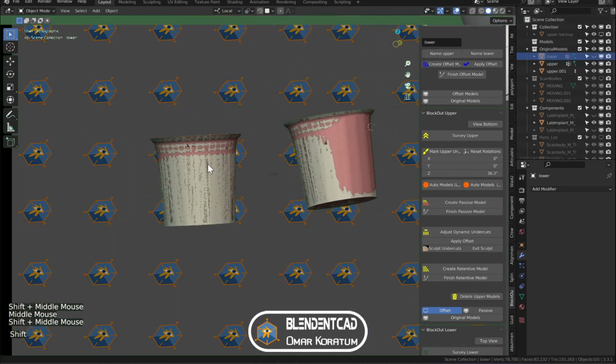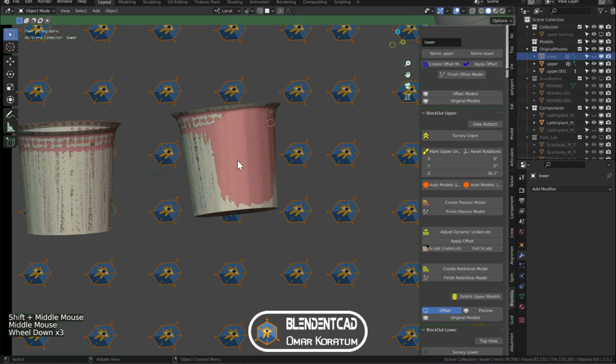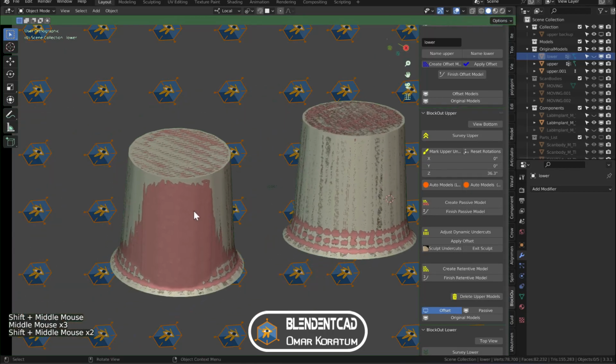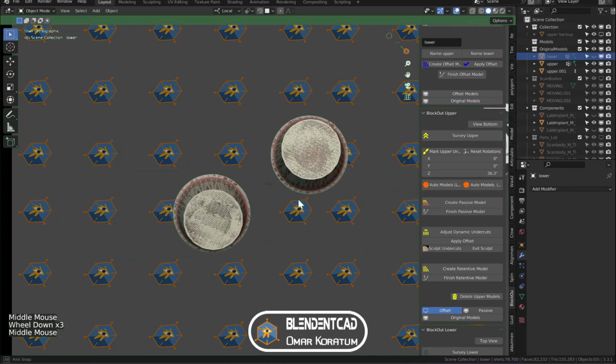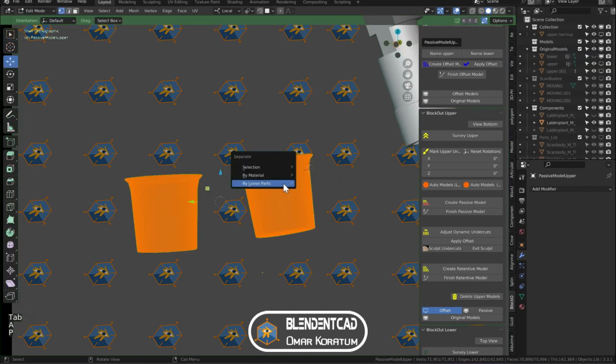After doing the same for the other abutment, you can appreciate the difference between the blocked out sleeve and the original sleeve. As you can see here, all this was an undercut area which has been blocked out. The same for the second abutment, but from the other side, so that we can have a similar path of insertion. Before going to crown fabrication, we have to separate the sleeves.